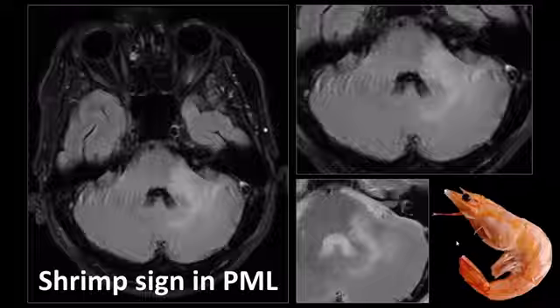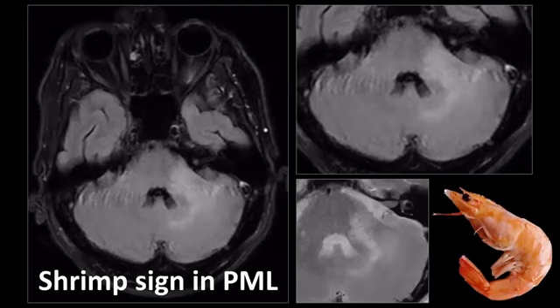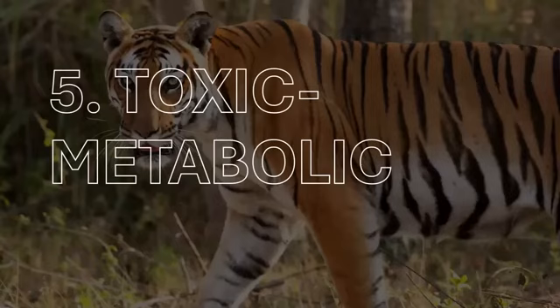Personally, I think this belongs to the category of one guy who once saw it in one case and decided to make it into a sign, because I don't know. I don't really find it all that useful, but maybe that's just me or personal preference. I also don't know how pathognomonic this is. I think the Milky Way sign is probably a lot more specific for PML than the shrimp sign, but I'm not sure. Okay, and that concludes signs in infectious and inflammatory disorders.